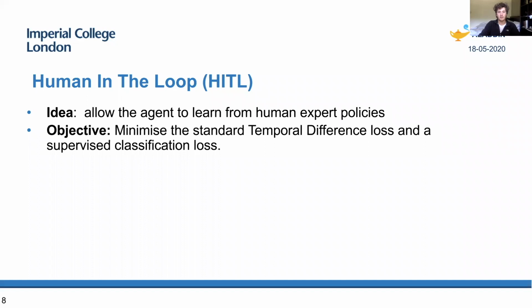An algorithmic extension allowing the agent to learn from human experts was implemented. The reason why this was investigated was that by learning from an expert, the agent may learn a final solution which improves its overall accuracy in finding the landmark. Additionally, by first observing the human, the agent may learn faster, therefore increasing the training efficiency. And finally, by mimicking the expert in some manner, it may yield a more explainable policy. For example, following the arteries to the heart rather than going straight there.